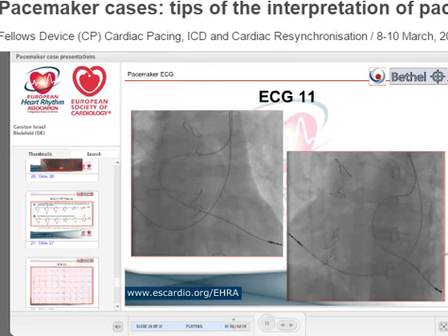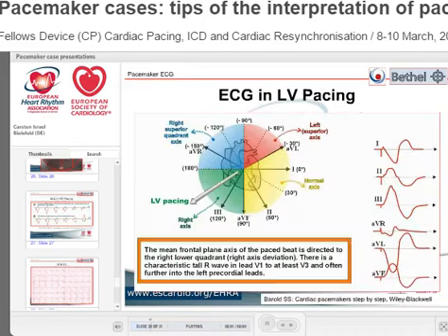And in fact, because the patient had heart failure and had Coumadin anyway, I left it because I said, wow, this is endocardial left ventricular pacing, something many people try to get by lots of difficult techniques, and we have it for free in this patient. And in fact, he recovered dramatically. So what I wanted to show you: LV pacing has a typically funny axis.